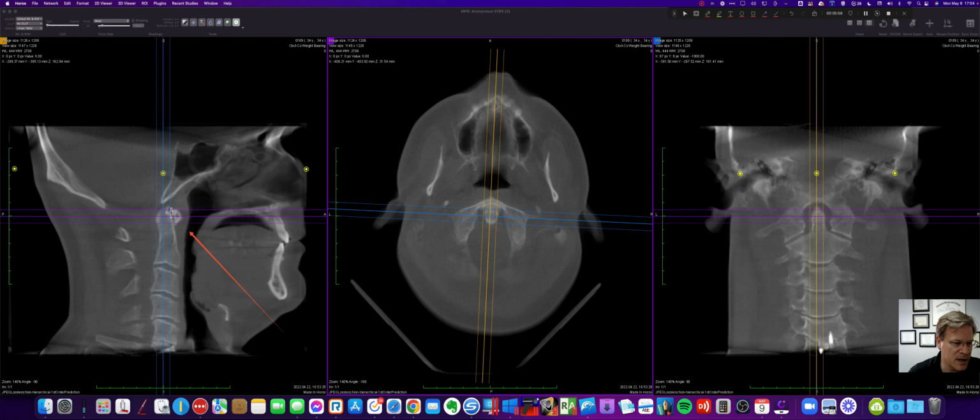here, not necessarily square to this, and he developed an algorithm for us to determine the convergence angles of the atlanto-occipital joints, or the condyle specifically. Well, we can develop a procedure later to maybe do that better, but the easy thing to do right here, okay, come out of there. I don't want any more. Oh, actually, but if I hit that, there we go.